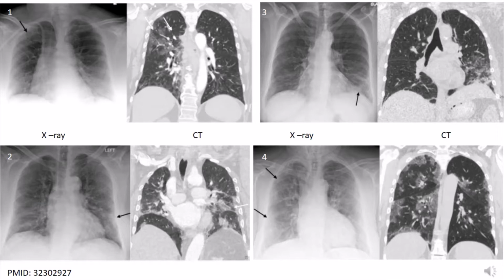In Figure 4, the hazy pulmonary opacities on chest X-ray can sometimes be diffuse, making identification challenging in some instances. Chest radiography, left, with subtle ill-defined hazy opacities in the right, black arrows, greater than left lungs in a patient with COVID-19. Findings are easier to appreciate on subsequent CT the same day, right.